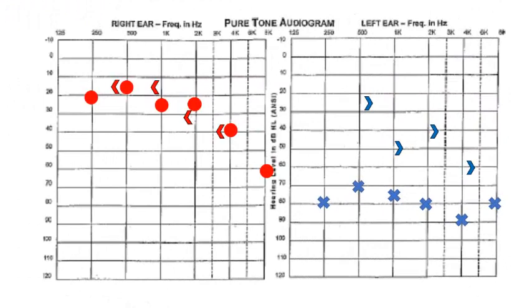If we look at the hearing on the left ear, though, we see a masking level of 60 doesn't really make any sense because it's below the hearing levels of that ear. So that's what I mean when I say this method doesn't consider the hearing of the non-test ear, the actual air conduction hearing. So let's check out and see if we can find an unmasked test level that would work.